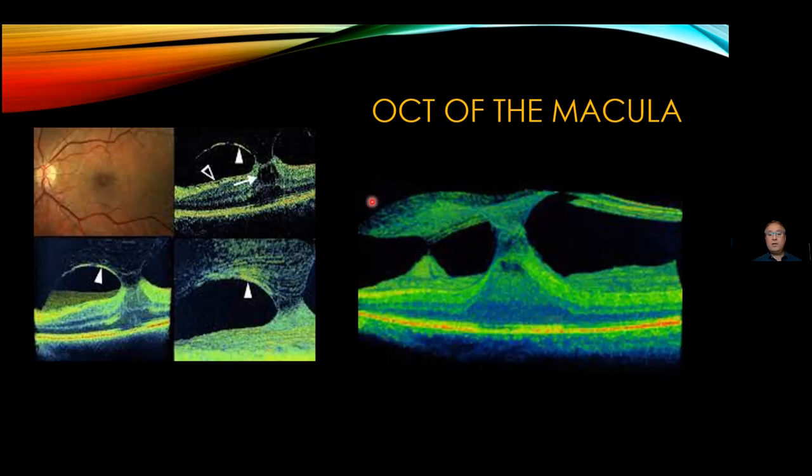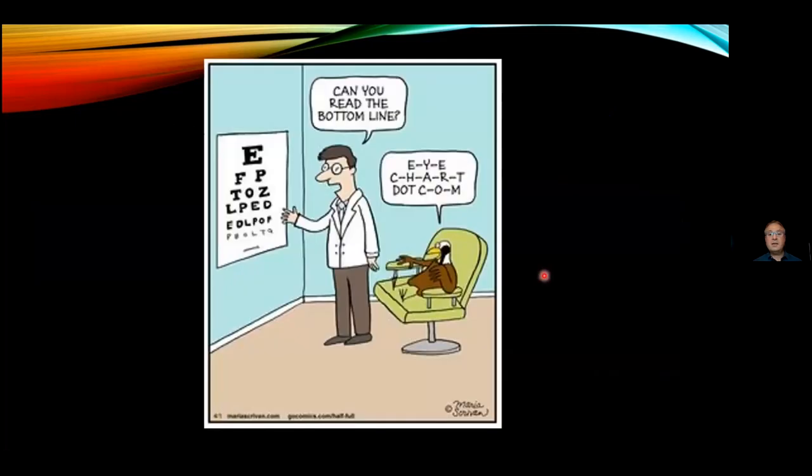But with the advent of the OCTs, a whole new world opened, and it really revolutionized ophthalmology. So we could now have a linear scan, a side view of that same structure that we're looking at. And with modern technology, we can even create a three-dimensional model. That gives us an idea of what the pathology is, how we should treat this patient, and what we should do with the follow-ups. So long gone is the day that we do a visual field and a couple of small tests.